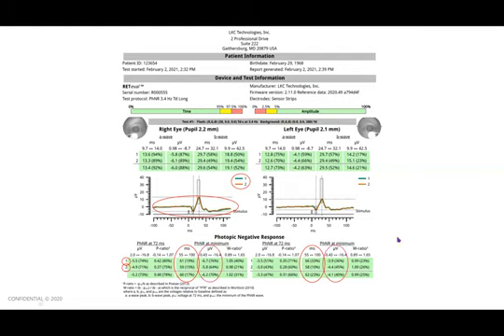The next thing I look at is amplitude. For this particular patient, there are fairly strong amplitudes, 76th percentile, 64th percentile in the right eye, 36th, 45th percentile on the left eye, both well within the green. A little bit of asymmetry between the 2 eyes, not too much that I'm concerned. This is a measure where, if it were significantly lower and in yellow or red, I'd be concerned that there was already damage that has occurred in the eye. And you may already see that in some of your structural diagnostic tools.